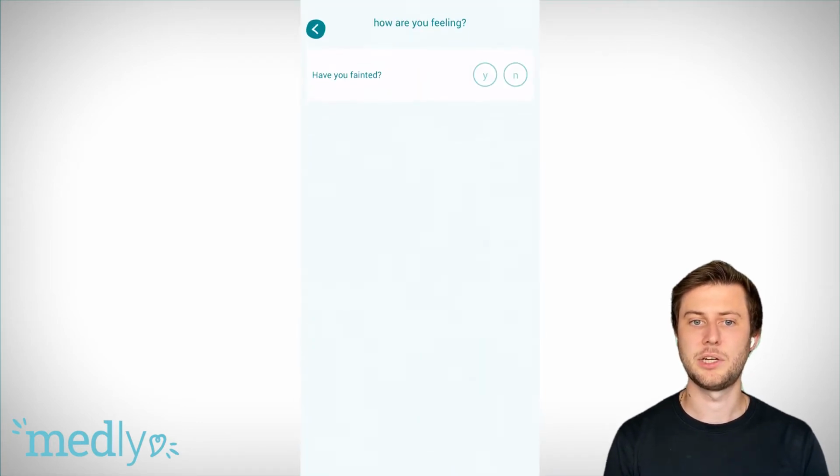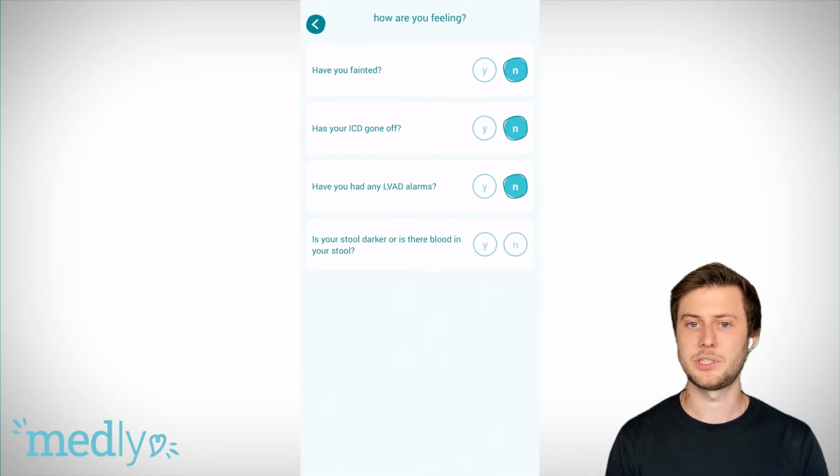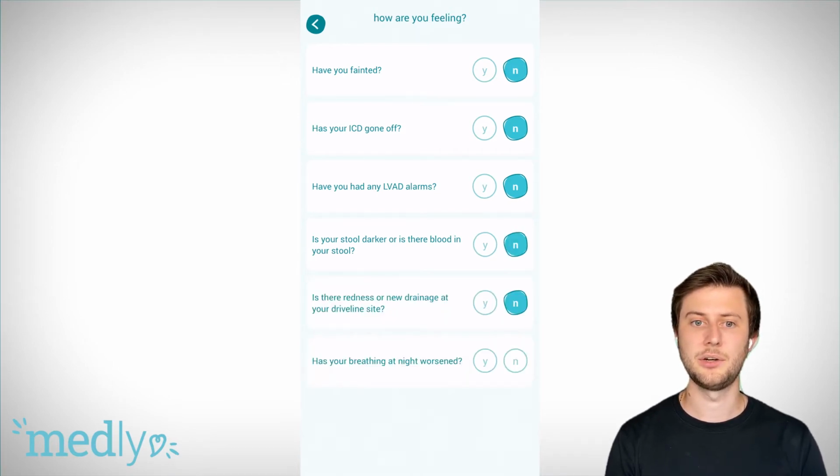Symptoms questions are presented one at a time, and you'll notice there are some specific ones like ICD and LVAD, and these have been set by my specific care team to show up only for me. I'll continue on though, and I'll just say no to the rest of these.